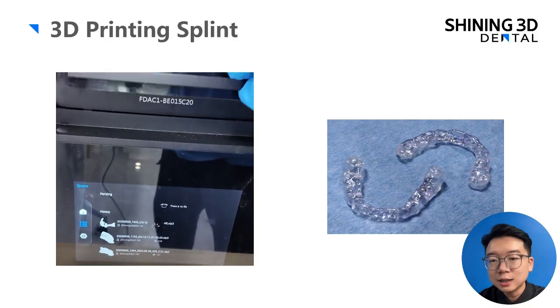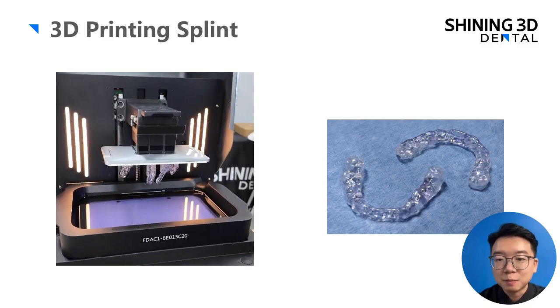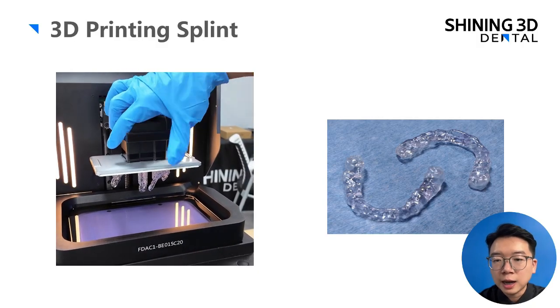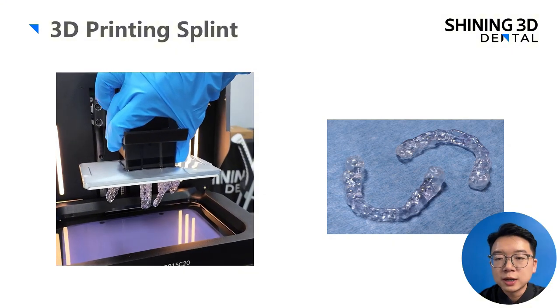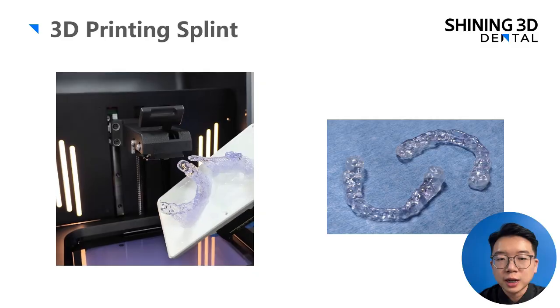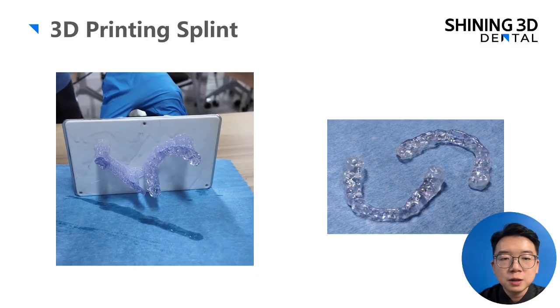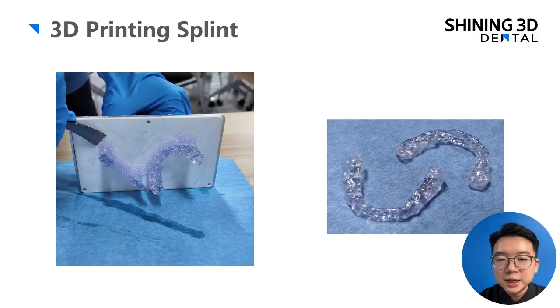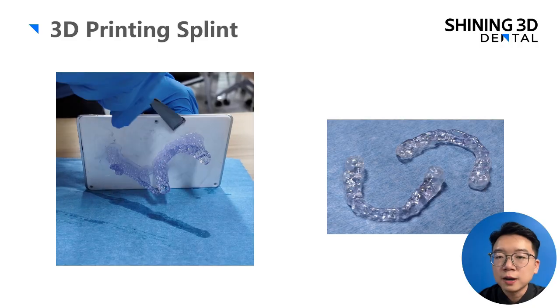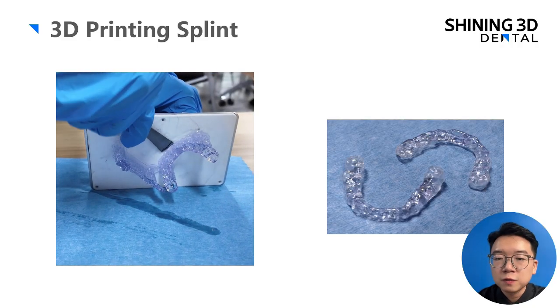Once the design is done, we can use the 3D printer to do a 3D printing for the splint that we designed. And inside the video here, we are using the AccuFab F1, the newest Shining 3D printer, to do the printing for this application. And we're using the splint resin material to do the printing. Once it's finished, we can use the nitrogen curing unit to cure it, to give it a polished look, to reduce the post-processing time, of course.